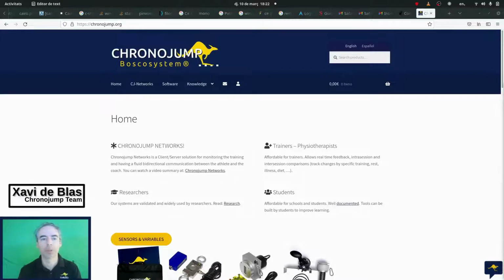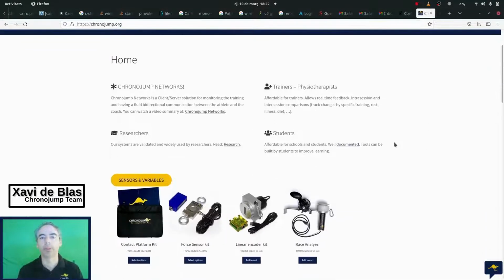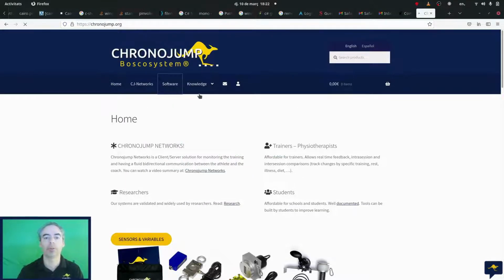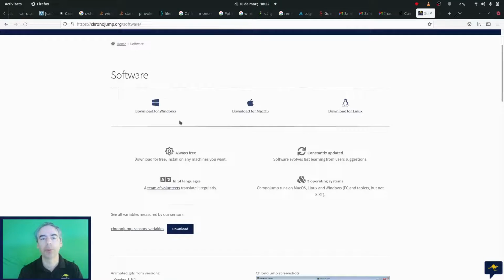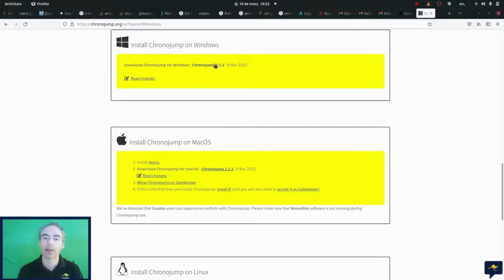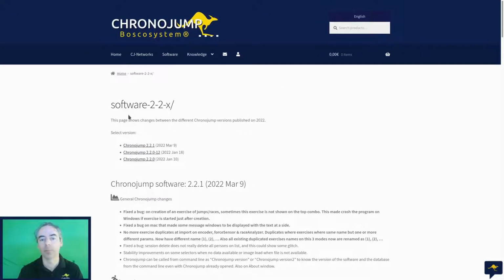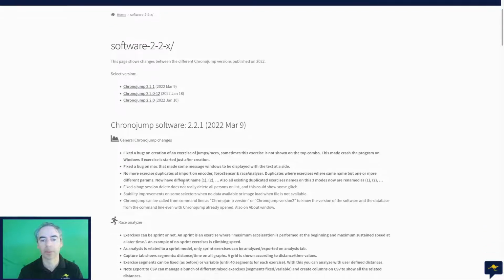Hello everyone. On March 9th, we published Chronojump 2.2.1. A complete log of changes of every Chronojump version can be read on our website, clicking on Software, Read Changes. This video will comment on the most relevant ones, most of them in bold, of that page.